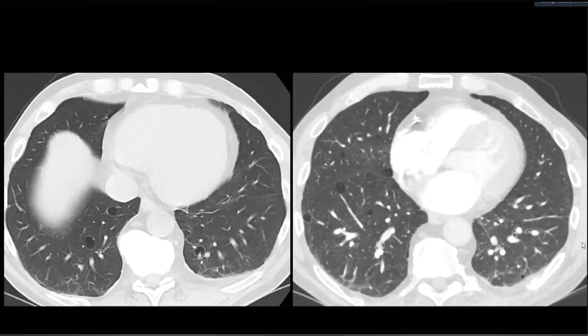I think so. These are not bizarre shaped. These are well rounded. Don't you agree? Yes, sir, they are round, predominantly in the lower lobes. And they also have this rounded opacity to it. Can you see my pointer? Yes, sir. Look at this dot-like opacity. What do you think this is?